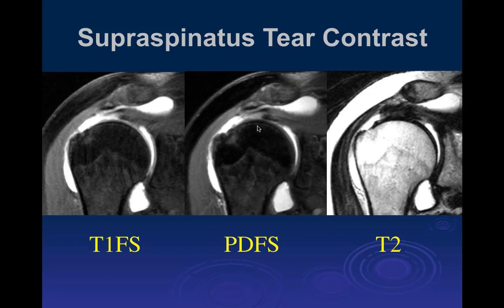John, do you want to comment on that? It all depends on how much fraying there is, and I'm not sure you can determine by what we're looking at. Yeah. I would like to see the muscle a little better, and this is a little small. The field of view is a little small, don't you think? Well, I cut this down just to show the tendon. The actual images show more of the muscle. I understand this, but that's why when you're asking for a surgical opinion, I would like to see more muscle, and then decide. Yeah.